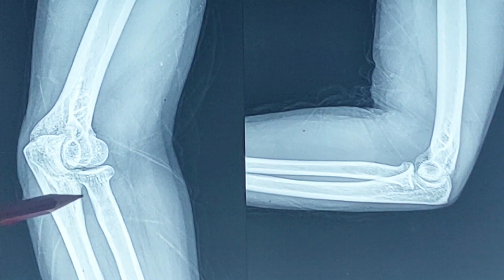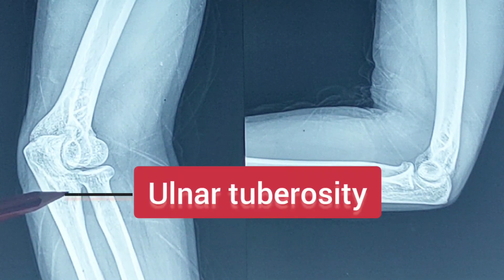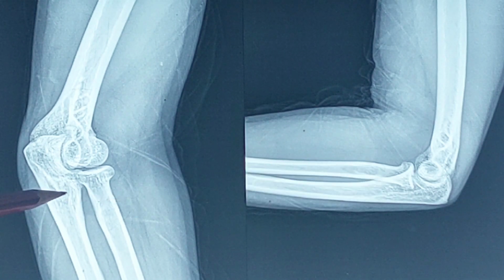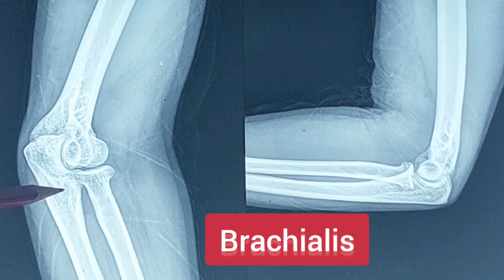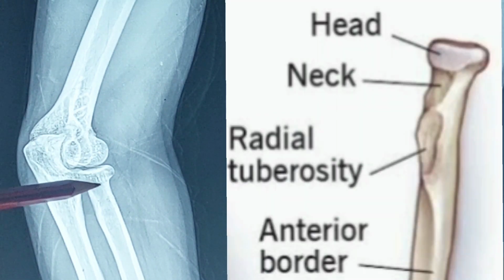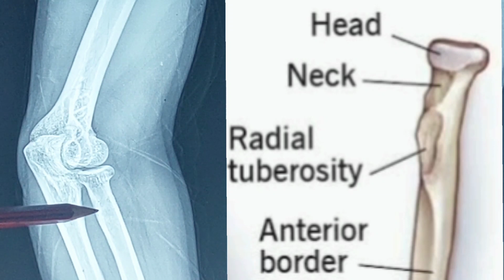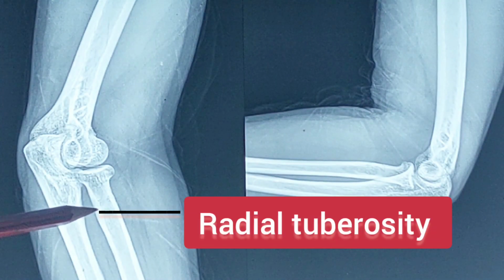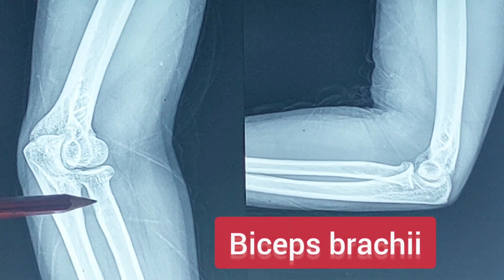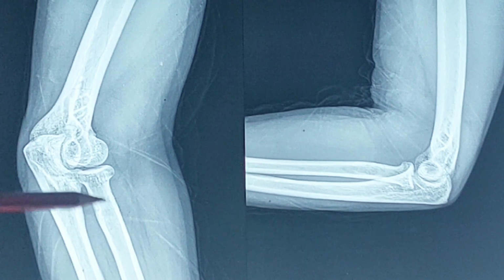Below it here is the ulnar tuberosity. On the ulnar tuberosity is the attachment of the brachialis muscle, which is a flexor of the elbow joint. And here is the radius, the radial head. Then this constricted part below the head is the radial neck, and below it is the radial tuberosity. On the radial tuberosity, the muscle attached is the biceps tendon. The biceps tendon is also a flexor of the elbow joint.